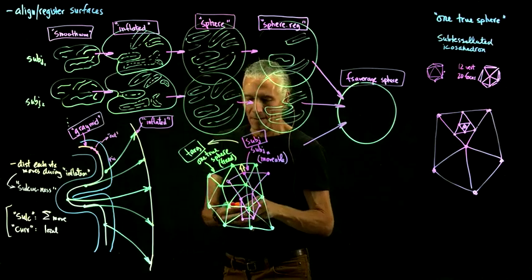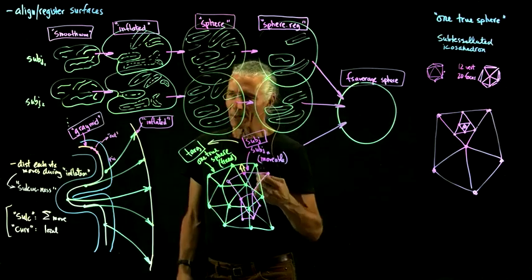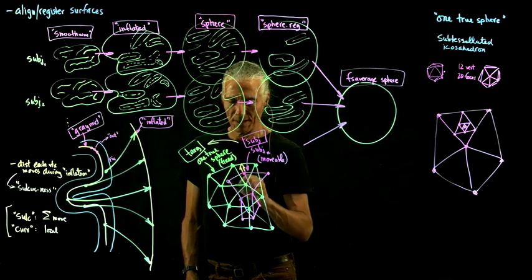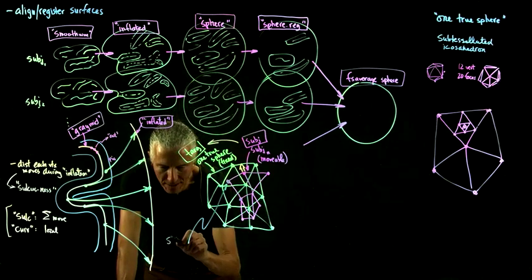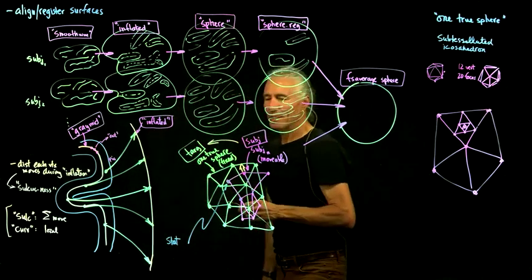And so what we need to do is, say you did some fMRI data and there's a statistic associated with this, say we've got some stat associated with that individual subject.